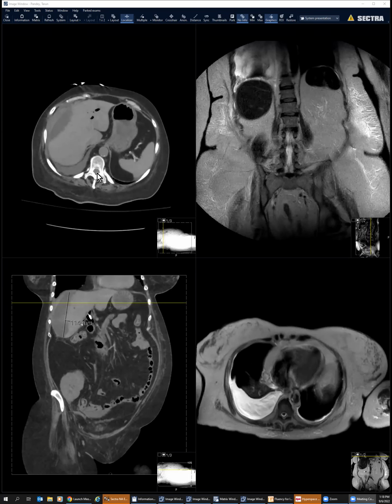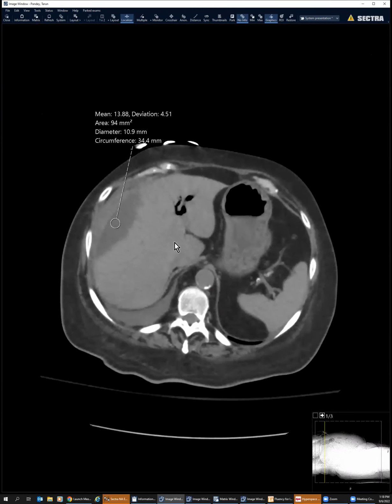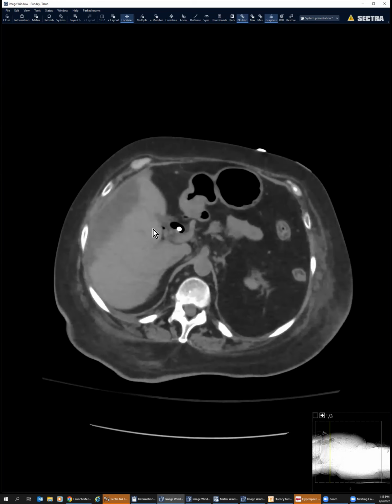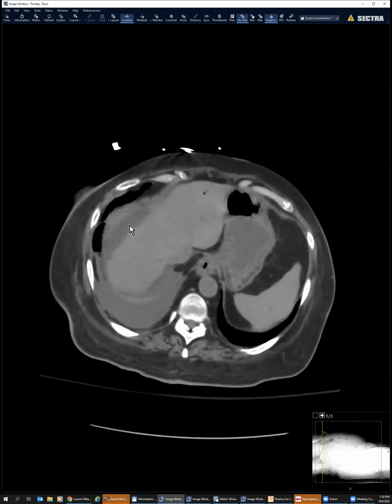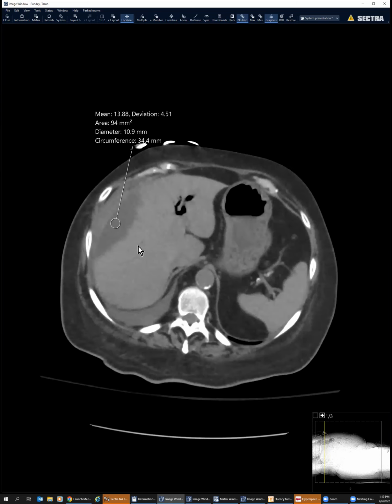Yes. Okay, so this patient had a history of cholecystectomy. Following that, there was a bile leak. They had to place a stent, and then the question was whether there's a biloma. So we did the scan. For some reason, I think this patient had renal issues, so they could not give contrast. So this was the thing.